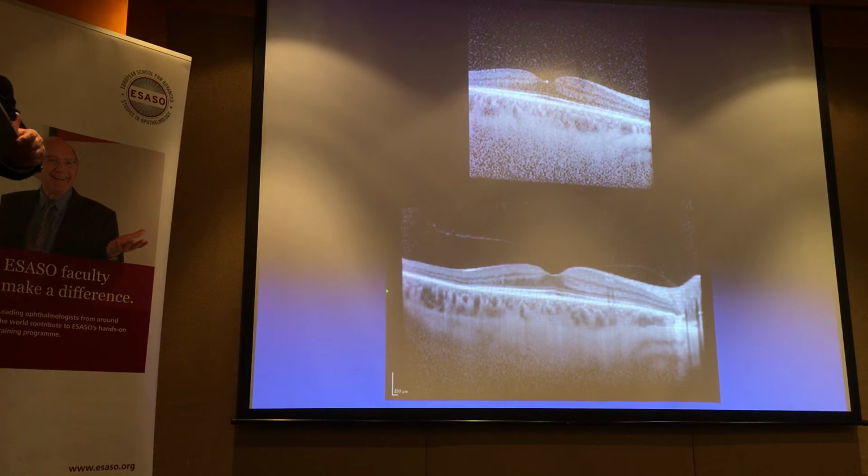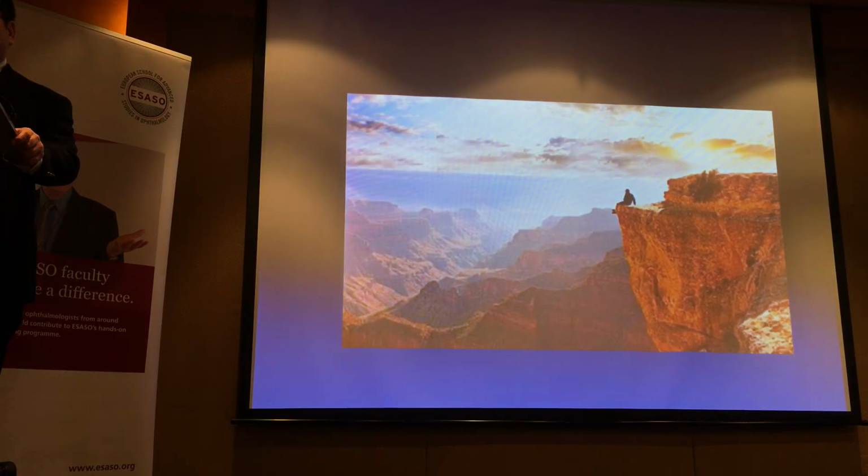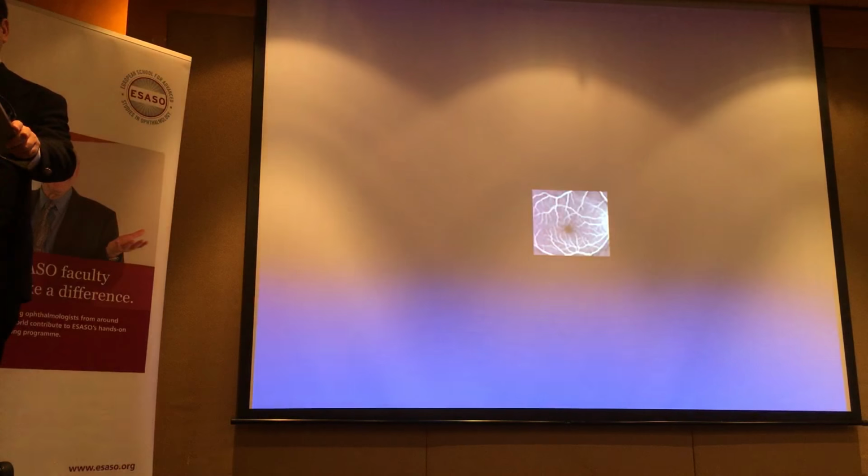And remember that even if this scan were normal, there could be other regions of the retina, superior, inferior, to look for. So, very important. So this is important to get the big picture, okay? And not just to focus only on one small area.